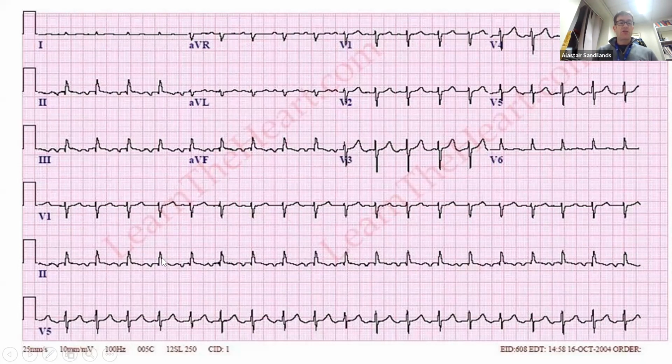So the QRS looks the same on every single beat, and the P waves look the same as well. So this time we've got the P waves that are going exactly negative all the way along, firing off atrial tachycardia going down to the ventricles every beat. So this is focal and discrete. You check everywhere. All the P waves are focal and discrete, negative inferiorly. So this is a run of atrial tachycardia now.